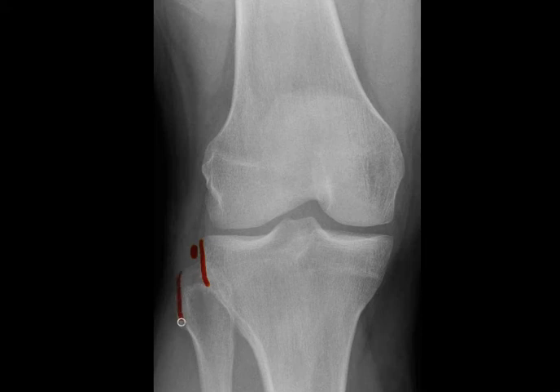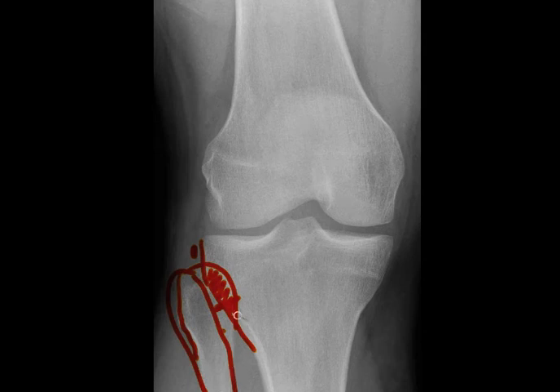The fibula head and the neck are intact. Look at this relationship where a part of the fibula head overlaps the lateral tibial condyle. This overlap is important. In the presence of a dislocation between this joint, the fibula tends to migrate and lies laterally. That is the usual presentation of this very uncommon injury.